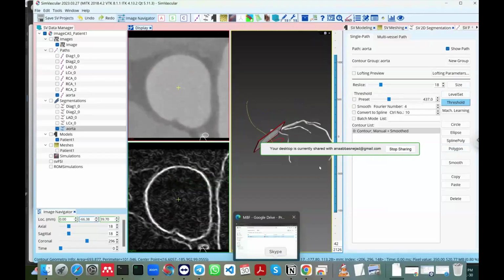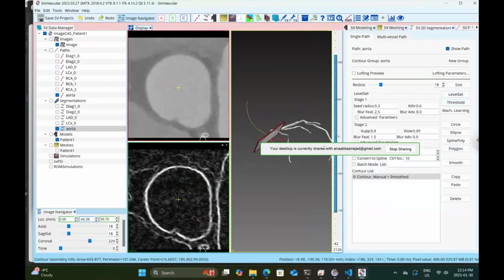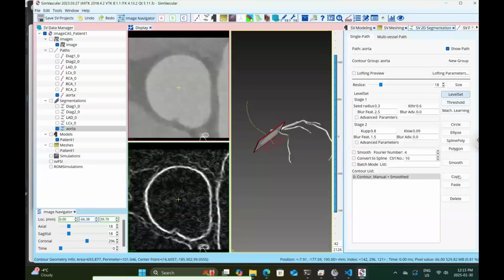Doesn't seem to be working. Maybe it was level set. Nope. Let me see. Yeah, level set. Interesting.